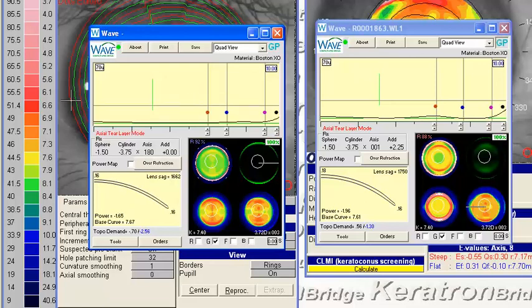But I think this particular design will give you a better chance of getting this lens to center well, hoping to get that bifocal right in the very center of the pupil. And I think that may also help improve some of your comfort issues, since part of those issues may have had to do with some of this erroneous data up in the upper and lower part. Once again, you might have to play a little bit with the edge lift and diameter, but I think this will give you a better shot of being successful.